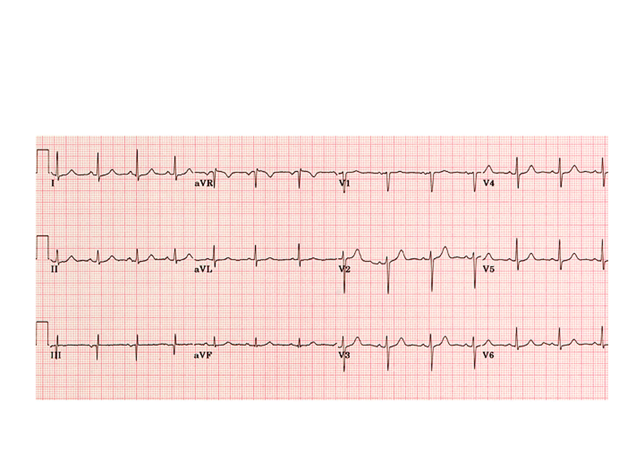On the precordial leads, it's a little bit more complicated than that because we're adding vectors in 3 dimensions and they don't quite follow those same rules. But if you look at the lateral leads like V5 and V6 and V4, they follow those rules. The anterior ones, V1, V2, V3, not so much, but we'll talk about that in more detail later.